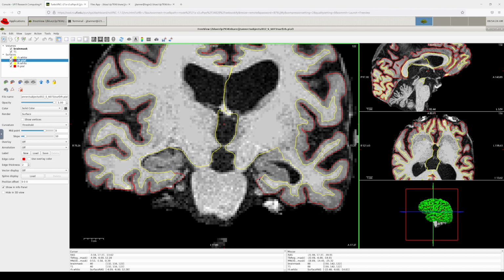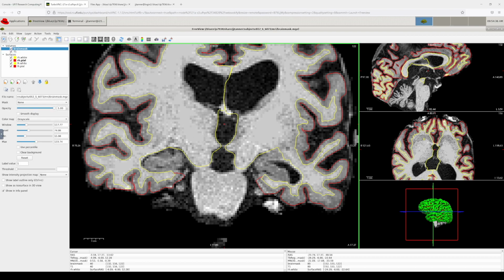This is an area, this is medial temporal lobe, and the rest of this is fine. The hippocampus doesn't get included in here. This is hippocampus right there. But let me show you something. Right here, there is a thin layer of cortex. And then just next to it, this little bit brighter, these voxels there, that is actually dura mater. That's not part of the brain. And we can see it over here. So this red line really should just go straight up through this darker set of voxels and then connect right up there. And that is where the cortical surface is.